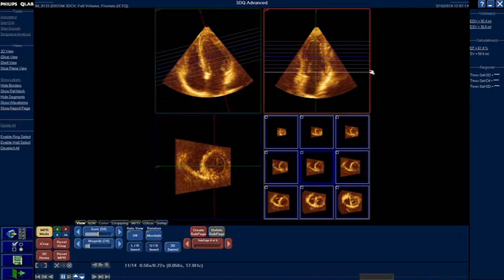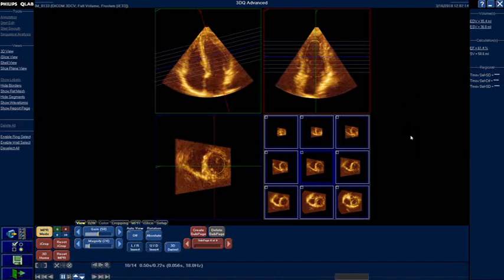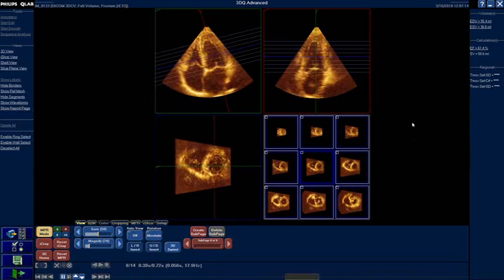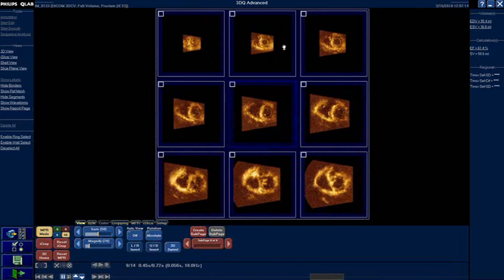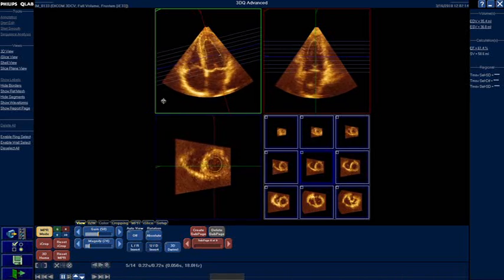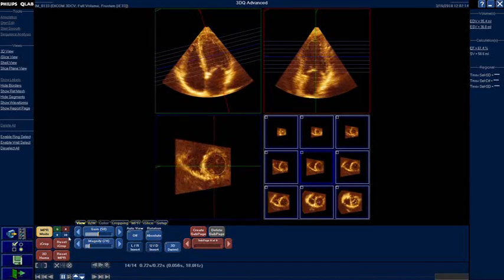Some labs are using this mode for quantification during stress echocardiography, like one volume at baseline, one volume at peak exercise, to save time. By this method they are cutting the left ventricle in many short axis cuts to see the subtle wall motion abnormalities. But this is still investigational and not recommended too much in clinical practice.